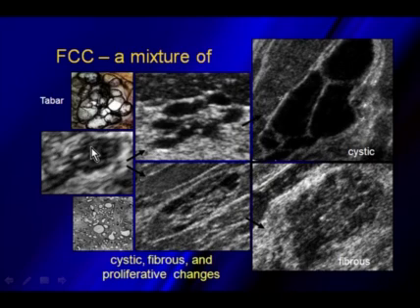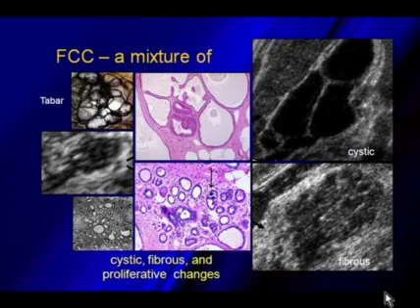You can see here we have the normal TDLU. These are going through cystic dilatation of the actual lobule, and the cysts get larger. These, I think, we'd feel much more comfortable just calling a cluster of microcysts. However, if it takes the route of more fibrosis, you can see why we have much more worrisome lesions, and these lesions typically will get biopsied because they are going to fall more into the BI-RADS 4 category, and sometimes we will get back the diagnosis of just fibrosis or fibrocystic change on these types of lesions.